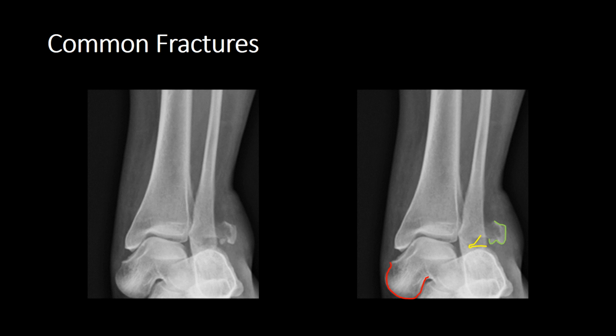So what's happened is the navicular and calcaneum have dislocated laterally. And actually, surprisingly enough, it's normally a medial dislocation. About 80% of subtalar dislocations actually go medially rather than laterally. And it's important to identify on the AP the direction of dislocation, because it can be quite tricky with lateral dislocations to identify them on our lateral view. So let's keep going.